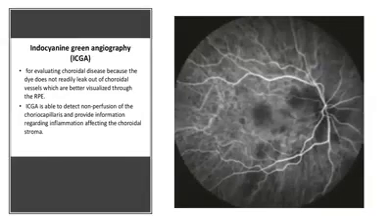Now, the next imaging modality is the ICG. The interesting thing about the ICG is we inject the indocyanine green dye, and this dye will not leak out of the choroidal vessels. So this gives an advantage for the ICG for a better visualization of the choroidal circulation, which is a very useful tool when we want to look for any inflammation in the choroidal vessels.